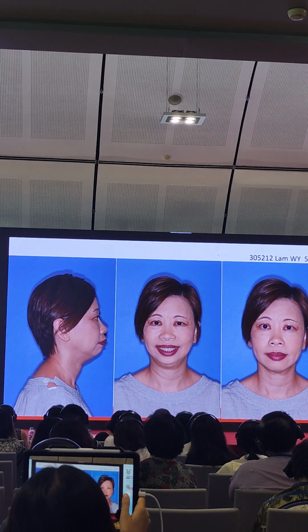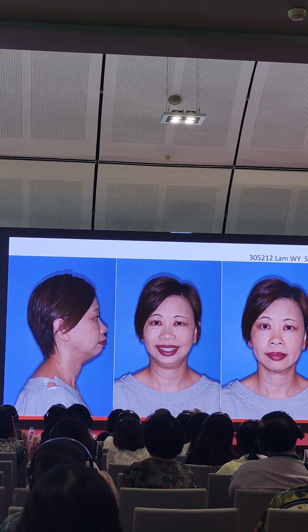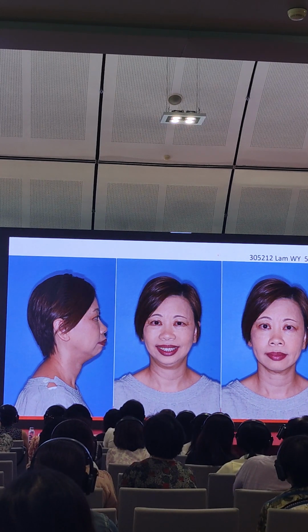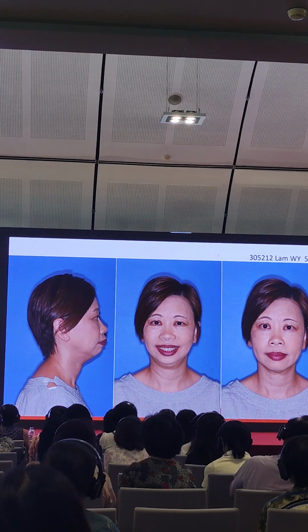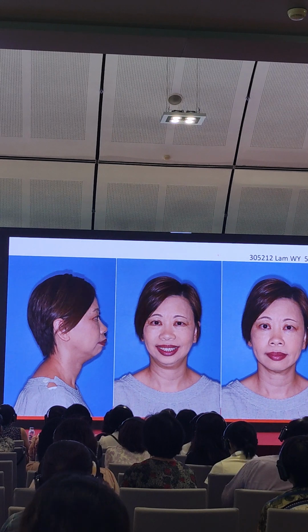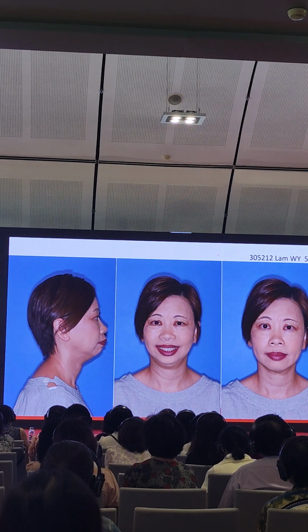For this 57-year-old woman, when we talk about multidisciplinary treatment or ortho-restorative treatment, you see more and more patients at that age, because they are losing teeth and they had no chance to do orthodontic treatment before. The teeth are not well aligned yet, and it's difficult for us to do the restoration before we organize the space and the position of the teeth. So when she came, she wanted to improve her smile and alignment.